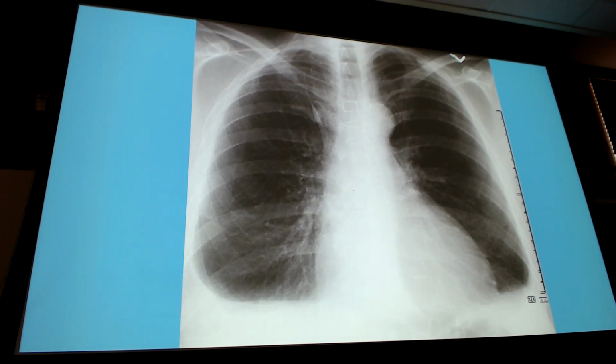So good. Those are pretty much the things I wanted you to see: the blunting, the cardiomegaly, the widening of the aortic root, and the atelectasis. Yes, sir?